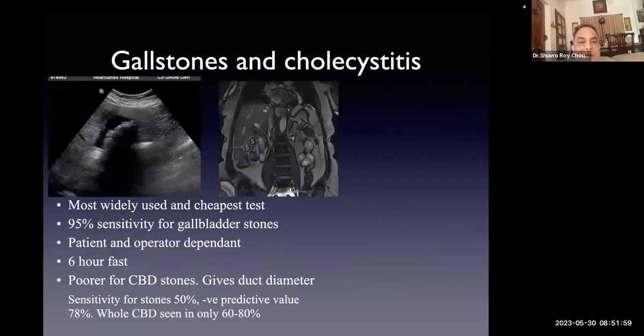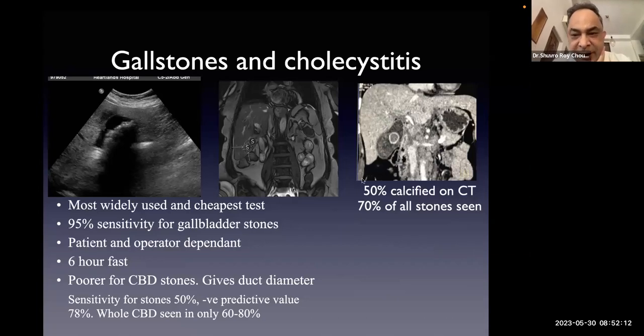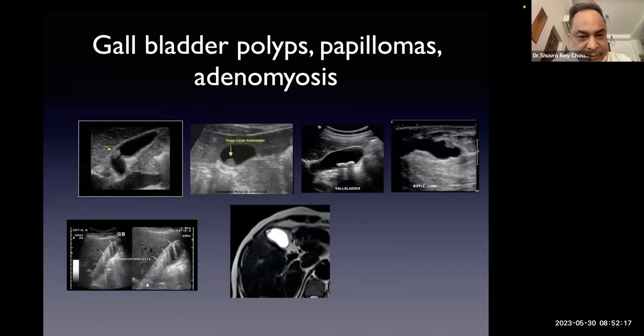So there are some more pictures. I just wanted to show you this. So on MRI, you wanted to briefly go through the anatomy. I'll do that. Let's see the picture.